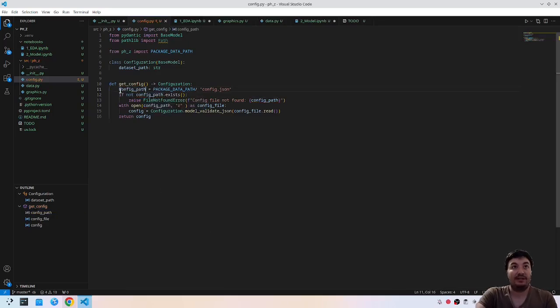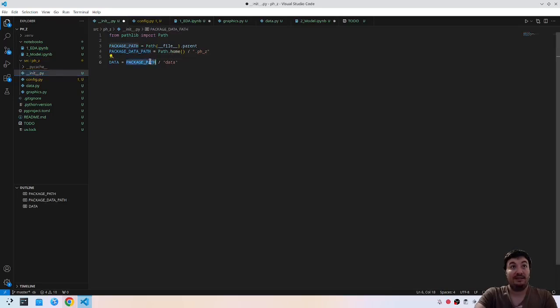And we can also actually, okay, let's put it here, and then if we can change it by an environment variable, we can do that. This will be like this. We can do data path parent exists, okay, something like this.